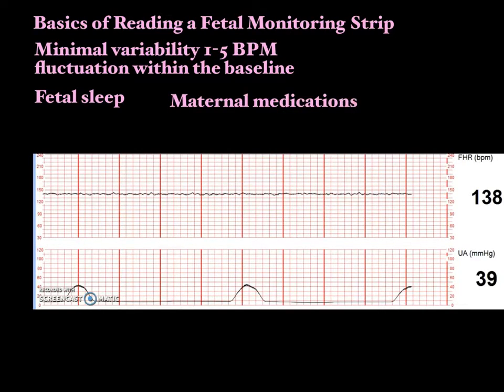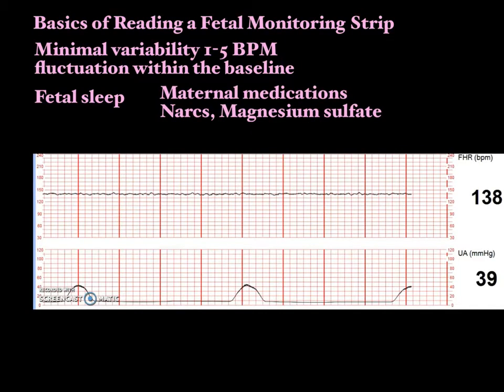Maternal medications, particularly narcotics and magnesium, can cause this pattern also. So if you've just given mom some narcotic pain medicine and she has this minimal variability, you expect it. And as the pain medicine wears off, the baby will start to look a little more lively. But just like mom is sleepy, baby's sleepy.